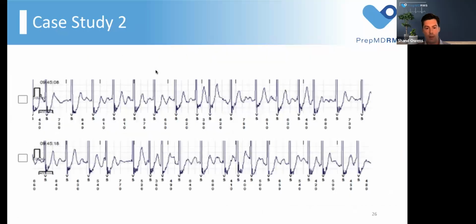So could we do next slide? So here's that same strip, but it's blown up quite a bit, 2 to 3 times. And we can get a little bit more of an insight of what's going on in between those R waves. So if you look at the end of the first line inside of this red box, what we didn't see when the episode wasn't gained up is pretty clear now. We can see a sawtooth pattern, which indicates a likely atrial flutter.